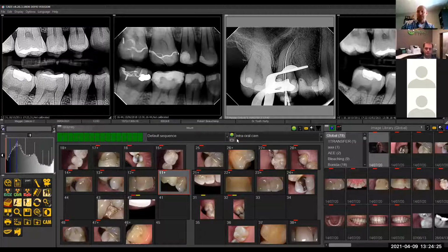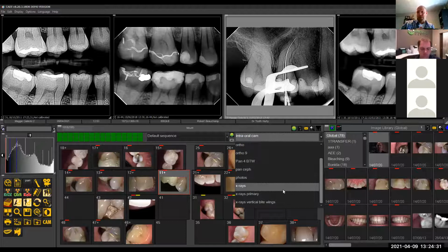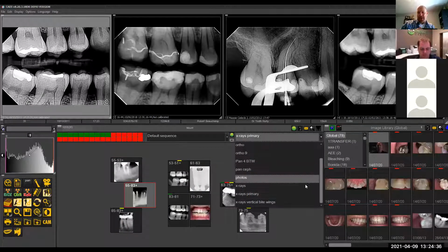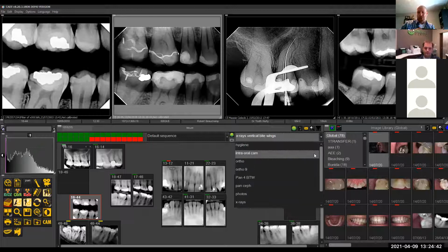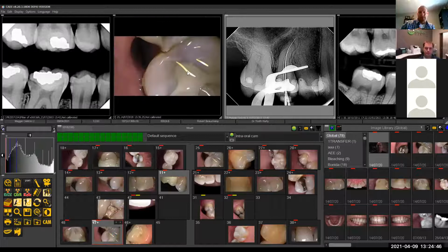And then when you get those pictures in, it allows you to easily show patients, be it an emergency patient, a recall patient, whatever the situation, you can get the images up side by side, which allows you to easily and quickly show them some of the concerns. So you go here, then you go to your intraoral camera, you're going to get the exact same tooth number up next to it. You're going to double click that.